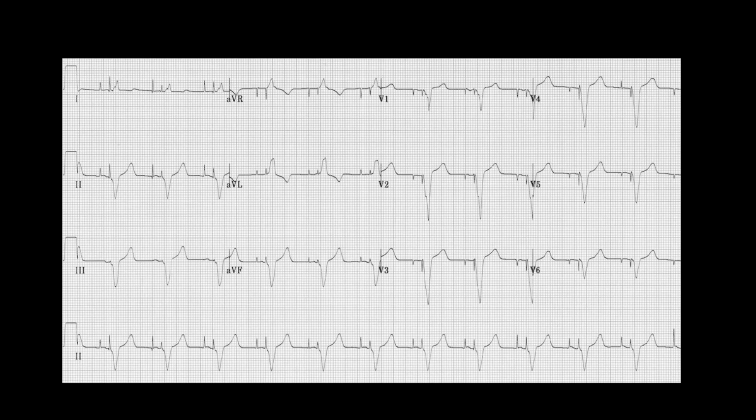Here I see 2 notches. This is an atrioventricular pacer. Since we are artificially stimulating the ventricle, you're getting an abnormal depolarization, so you're getting a wide QRS, and so you've got to use those same rules. I see ST elevation in V1, V2, V3, but the QRS is down, the T wave's up. It's no big deal. It's not greater than 25% the depth of the QRS, so this is what I would expect to see.